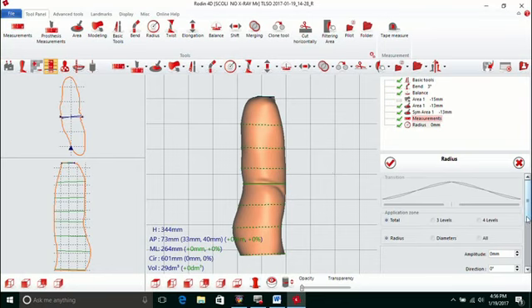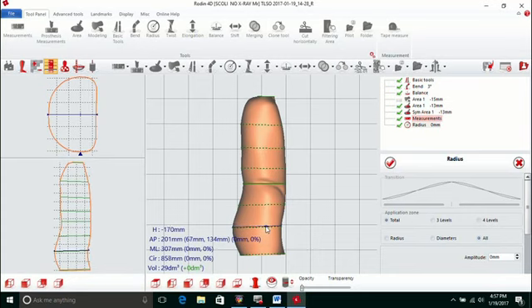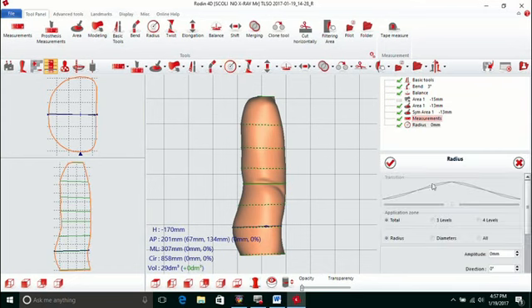It can act as a ply tool, where you can ply up like putting on stockinets, or ply down. And to do that, you leave it on total and you click on all. Increase or decrease your amplitude, and it's like putting stockinets on and off. So what you could do is left click on your model, put your cursor line at a certain point on the model, and you can actually watch real time the model change. So if you just want to ply up to hit a certain circumference, you can scroll up and down to do that. Now, we'll go back into that tool one more time.